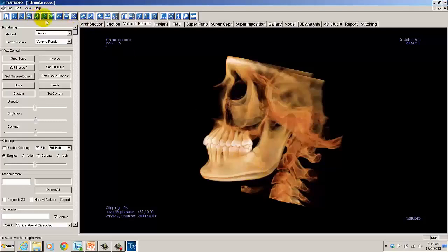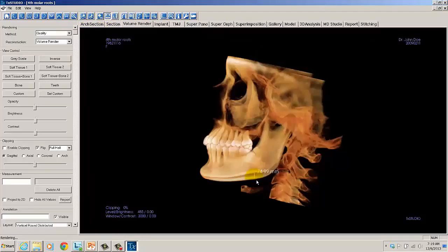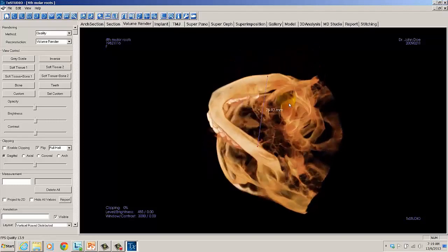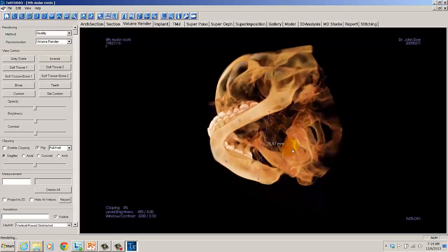and we want to look at the area across to the other side, from patient left to right. Then I would click on our measurement tool, click on an area of measurement, and click to the other mandible, deselect our distance measurement tool and rotate, and you can see that we've got a line measurement from left to right.